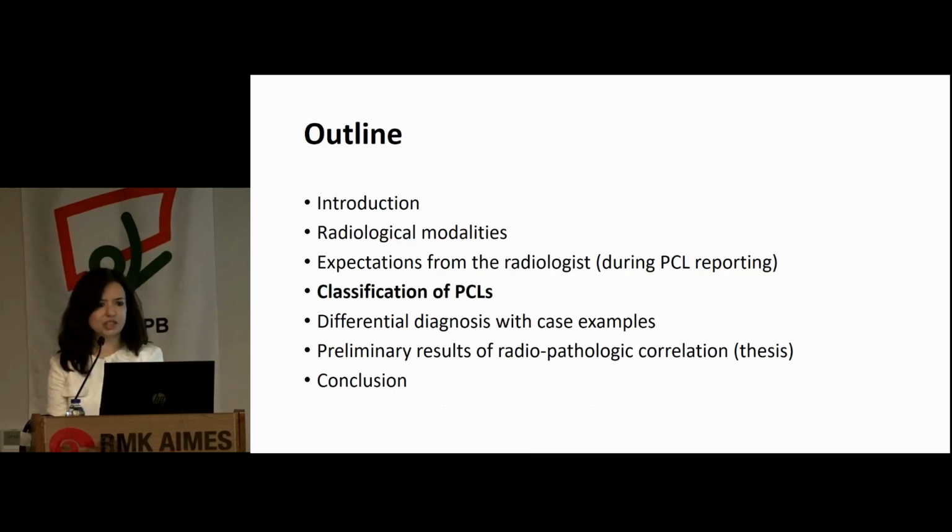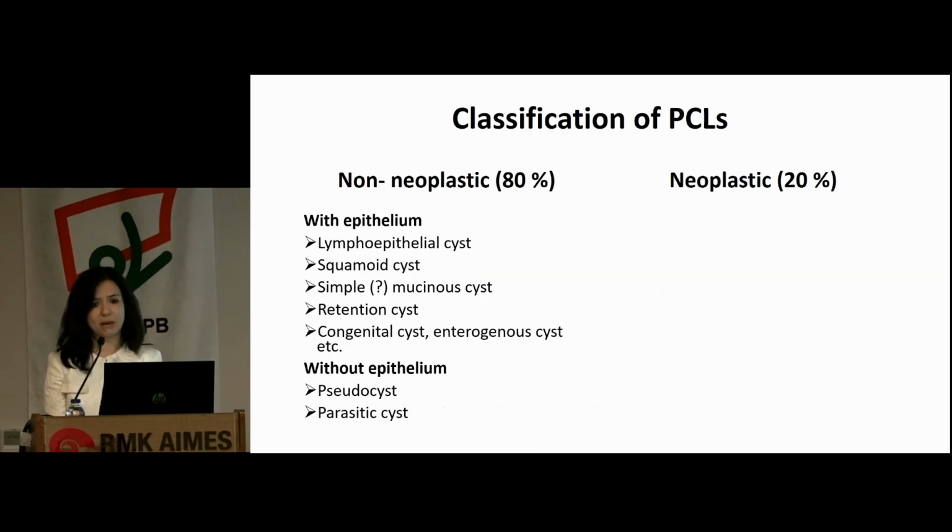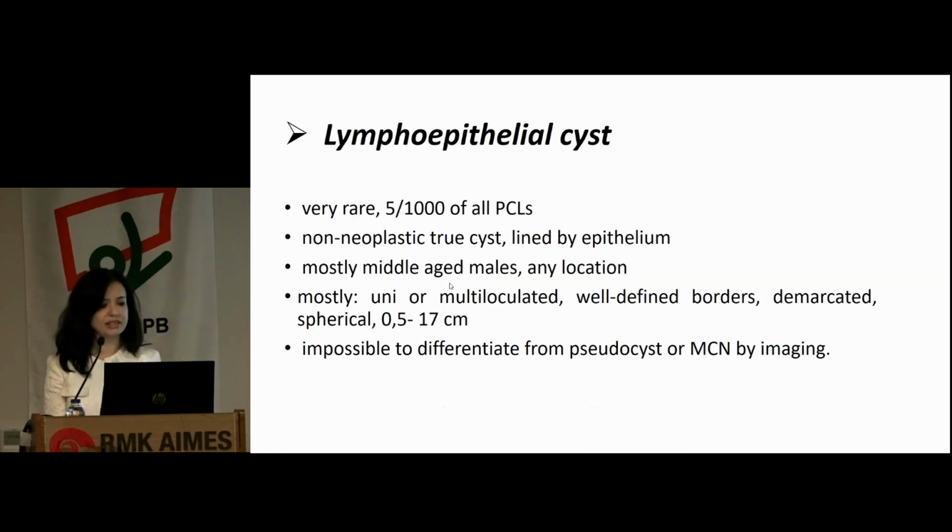There are different classifications of PCLs. We are using this one mostly in radiology. Most of them are non-neoplastic, and there are two main subtypes, one with epithelium and one without epithelium. I will start with the non-neoplastic cysts and show you some imaging examples.